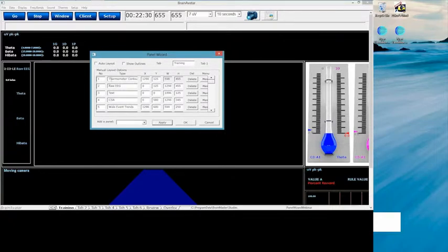So for our thermometer contour panel, it is located at 1298 X and 125 Y. So X is going to be horizontal, Y is going to be vertical. If I go and link that out, I'm going to see this is where my thermometer contour panel is.